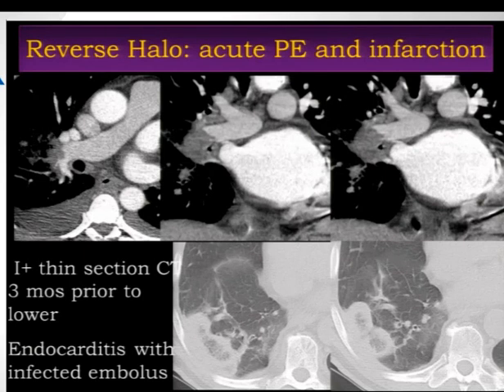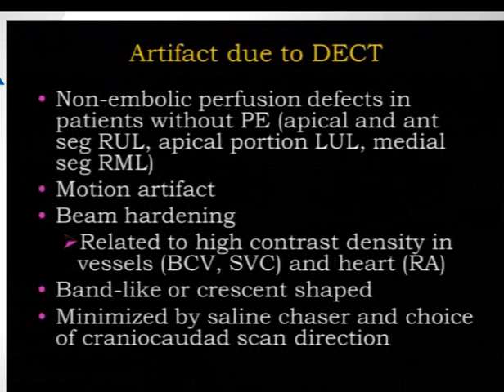Because there was a tunnel vision for bronchogenic carcinoma, the thought of an infarct and pulmonary embolism was never entertained until finally someone suggested, could this be an infarct, and indeed it was. This was infected pulmonary embolism, and this was an infarct, and the patient received treatment.